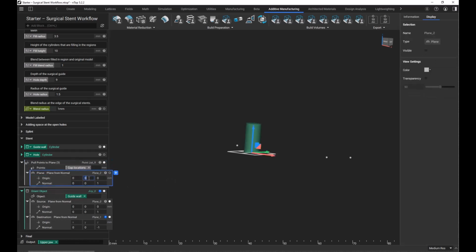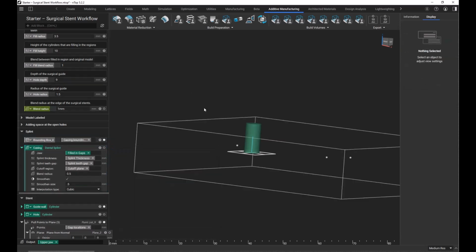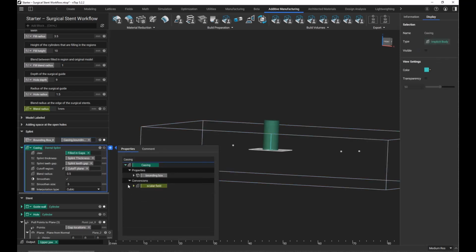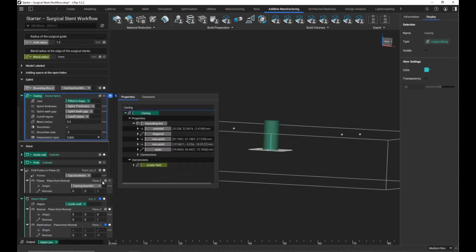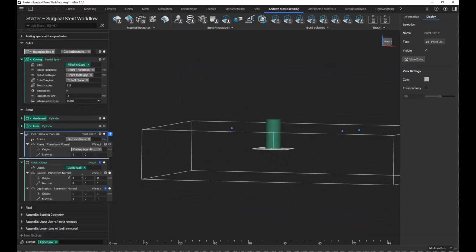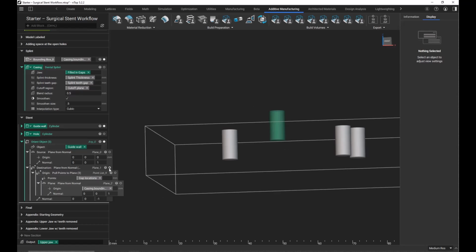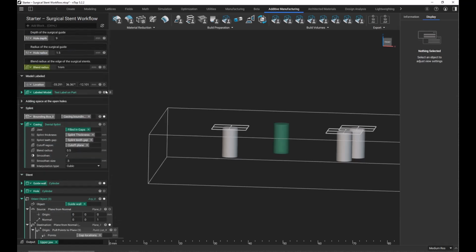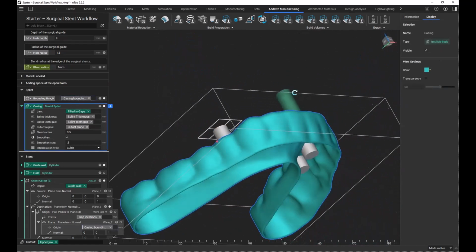And the plane is going to be, if we look at our splint, I'm going to take the bounds and I'm going to place it on the top of that. So I'm going to take the casing bounding box max point. And that's where I'm going to be pulling our initial points just right up to that plane, like so. So now if I place them here, we can see I've flipped the direction of our cylinders, and they're coming down from that max point. And if we look at this in comparison to our, let's see, our casing, for instance, we can see it's cutting through that like so.